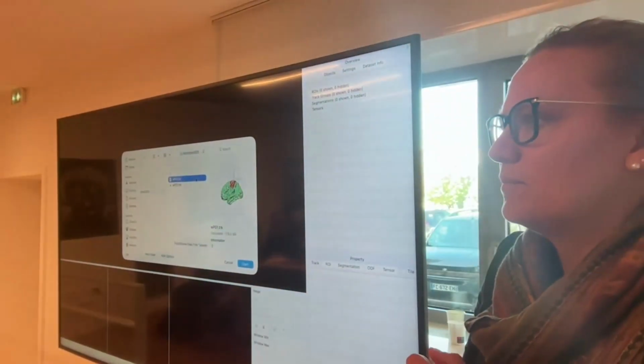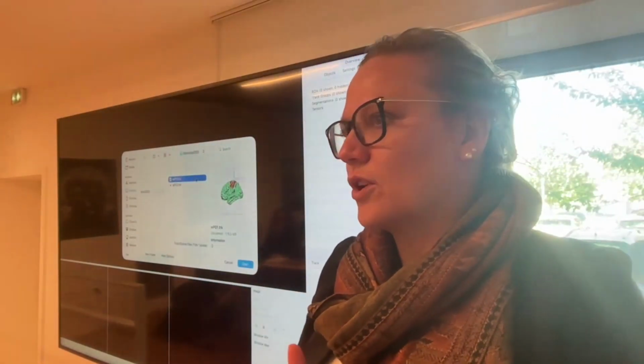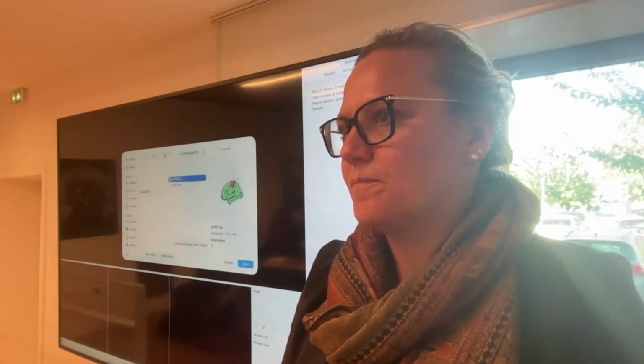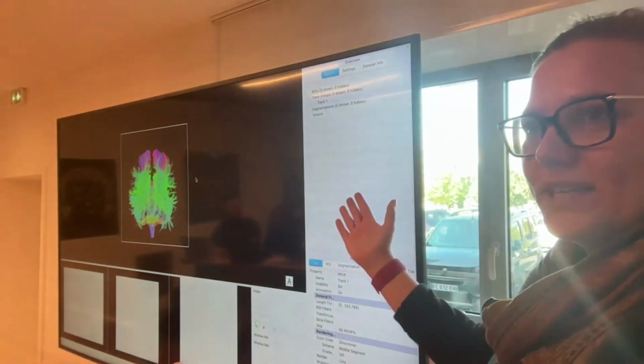And it will allow you to only open the TRK file. So File, Open Track or Scene, navigate to the folder, and we're all gonna open participant number 1 TRK file. So once we do that, ta-da, we see colors.